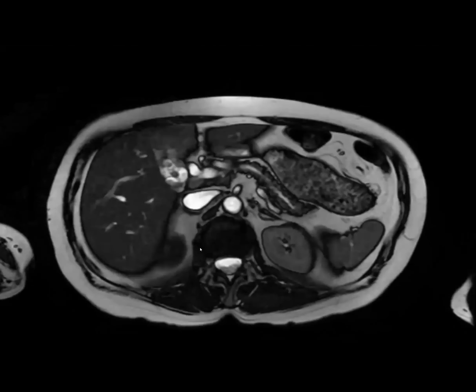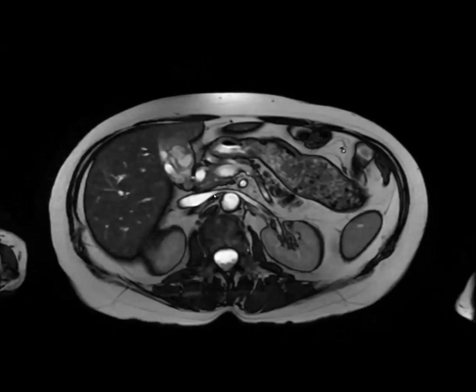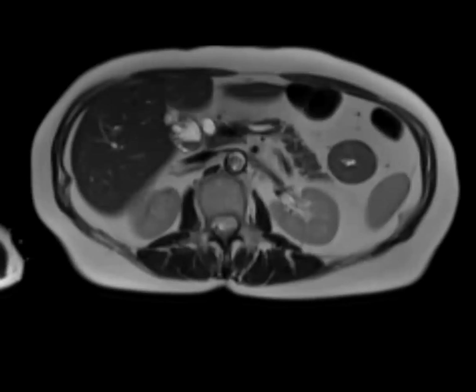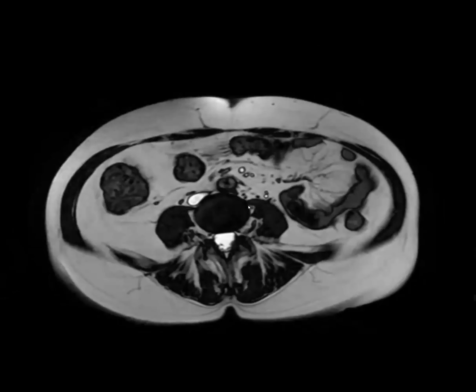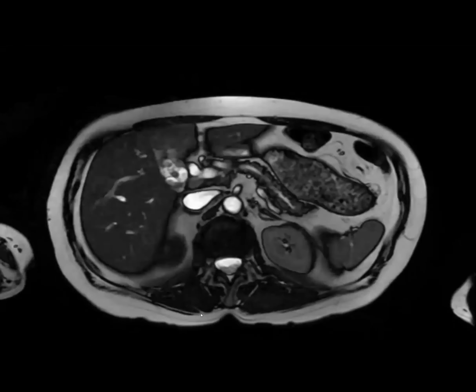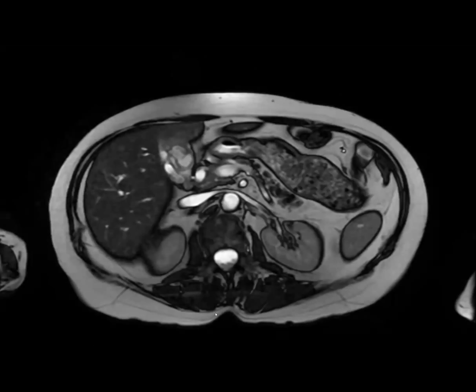Anyway, this went to resection, and this came back xanthogranulomatous cholecystitis on a background of florid adenomyomatosis. Wow. So it was both, and we brought that up preoperatively. What told us it might be that is that 6 months ago it just looked like adenomyomatosis, and 6 months later it looks more cystic, more inflamed, more thickened. Wait, you guys called it xanthogranulomatous cholecystitis pre-op? Yep. Wow, superstars.